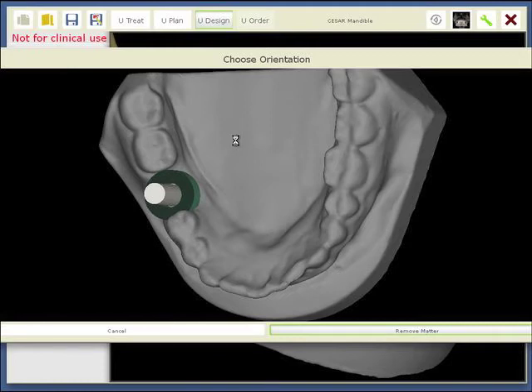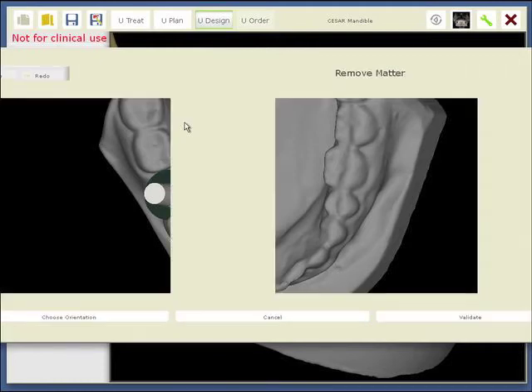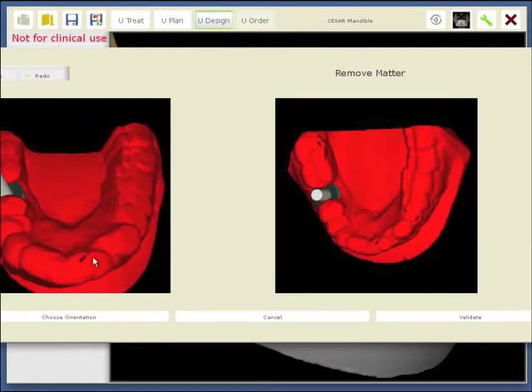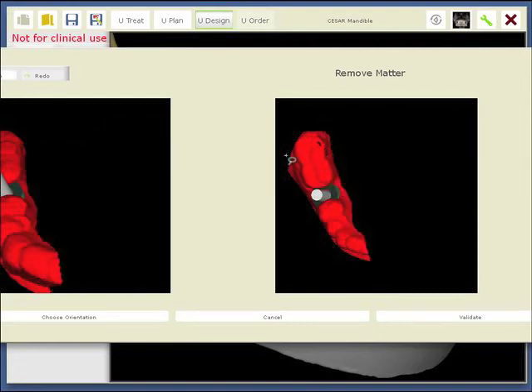We are going to keep a good support on the teeth, and on one side is the expansion of the plaster, and on the other side I use this, which is a lasso again, very simple tool. I go on top, I remove this, I have a good support with a triangle support, and I can select this. On the other side, I remove slightly at the back, I remove in front, and that's it.